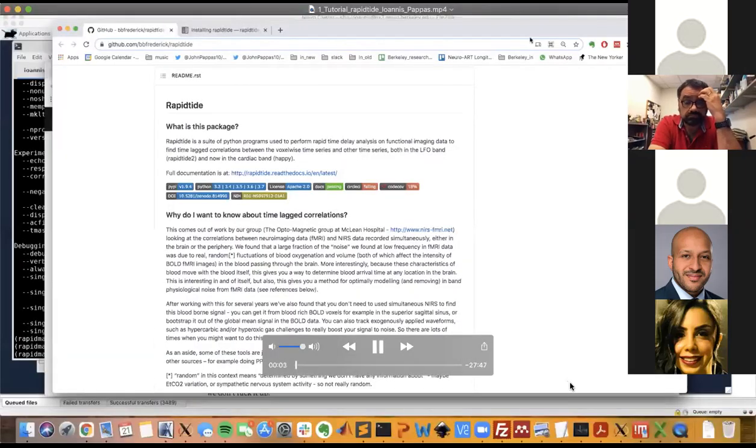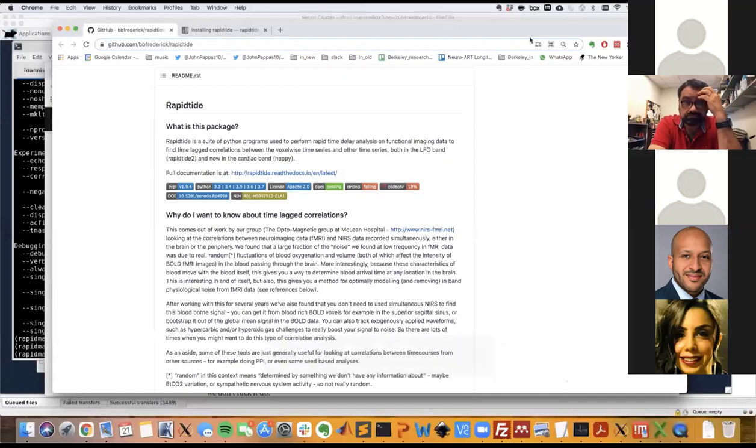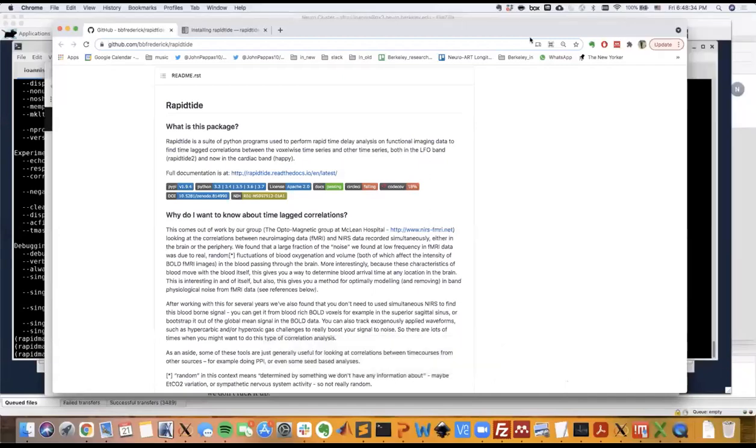Hi, my name is Ioannis Pappas. Hope you enjoyed the conference. In this short tutorial, I will show you a quick and practical way for denoising your fMRI data from the low-frequency oscillation signal. Okay, here we go.